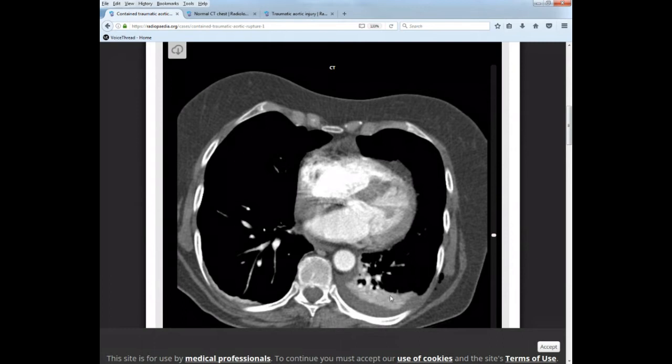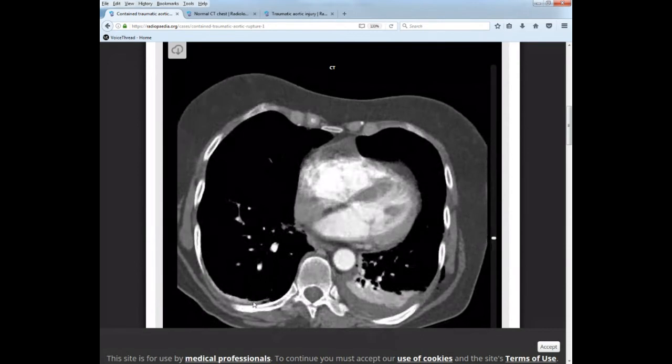So that's why we're able to see the space between the two different pleura. Over here, we have the visceral right along here, and parietal posteriorly, you can see, and then there's fluid in between the two linings, okay? So when you have traumatic injury or some kind of pathology that is occupying the space between the visceral and parietal, you have an ability to see that pleural space.